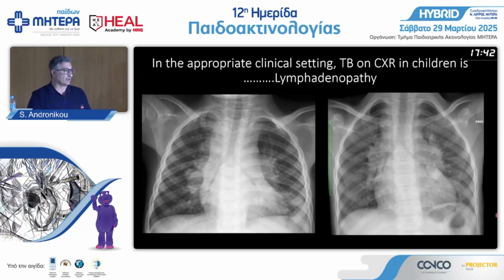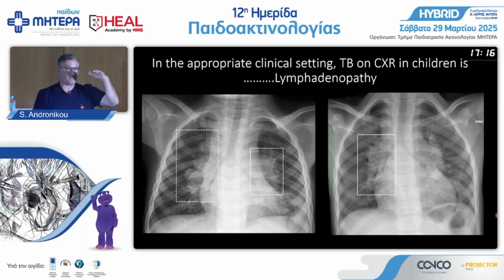So both these children have TB. Both these children have probably got the best example of an X-ray for, say, this child has TB, okay? And the place to look is the hilum, okay? You can see these are bulky, outwardly convex, soft tissue masses where you expect to see blood vessels diverging, separating from each other. And the other side is possibly the same. This patient a little bit less obvious, but again, it's convex on the outside, and that side is convex on the outside instead of concave. And I will show you against the normal in a minute. So this is what you want to do.